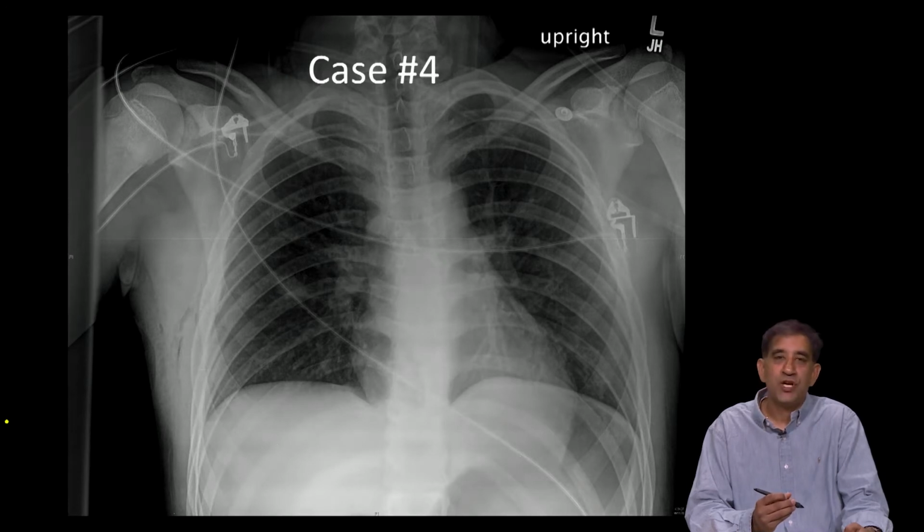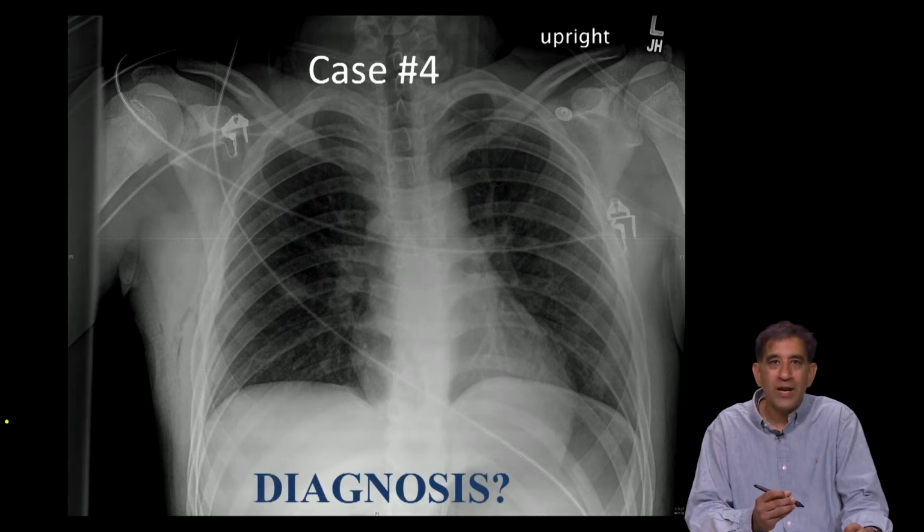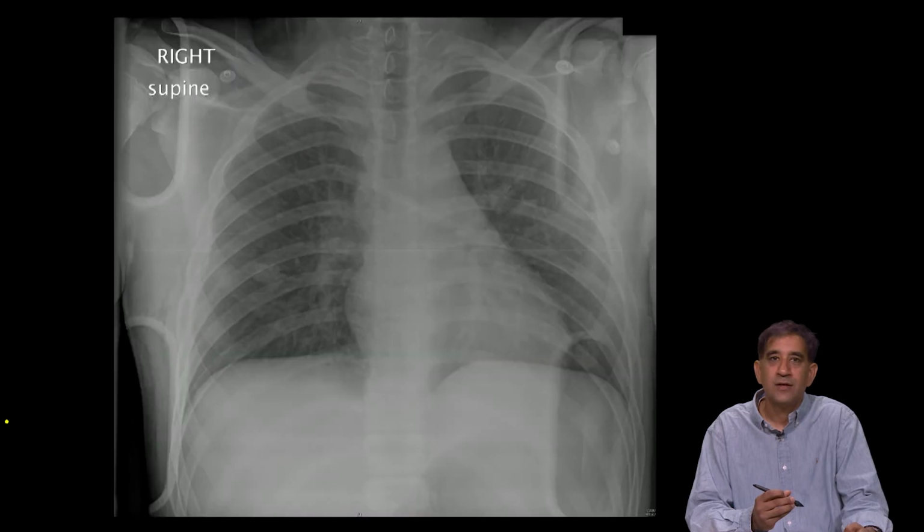And here is his chest x-ray, and as I mentioned before, the abnormality is not seen over his lung fields or his mediastinum or heart, it's actually to the periphery. So what was your diagnosis?